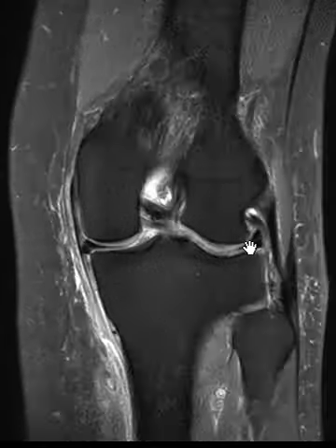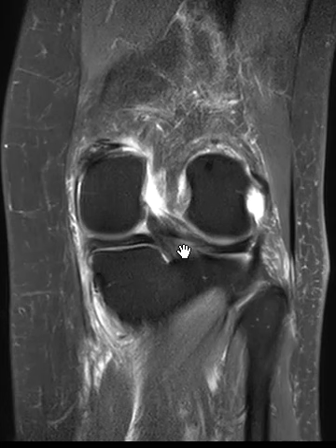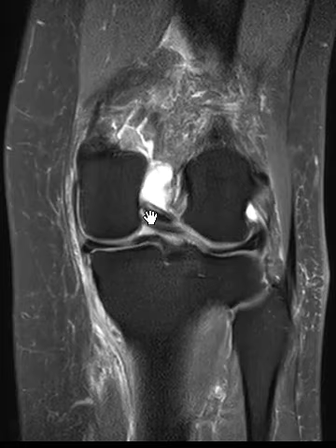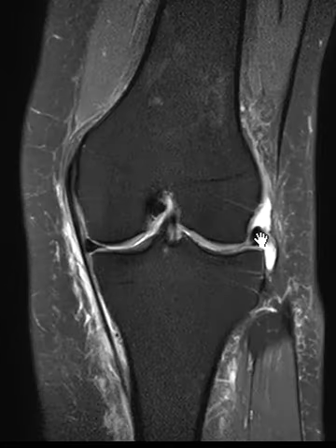There's a loss of hoop stress, so look back for a radial tear someplace, or look for a root tear like this where the root is torn and the meniscus is able to drift outwards. And again, this meniscofemoral ligament right here next to the PCL is hanging on, but not holding on as tightly, and so it's allowing the meniscus to drift outwards.